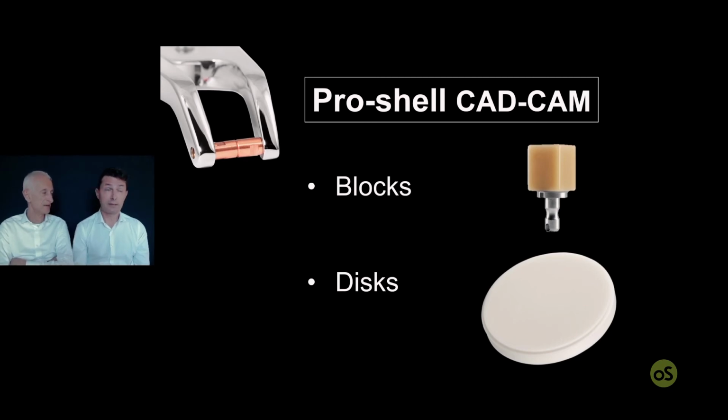many bridges. How many, for example? I think this machine, I think 20. If you have a shape in the software, 20 bridges, and it's possible to print it simultaneously. Yes, so this is really in half an hour, saving a lot of time.